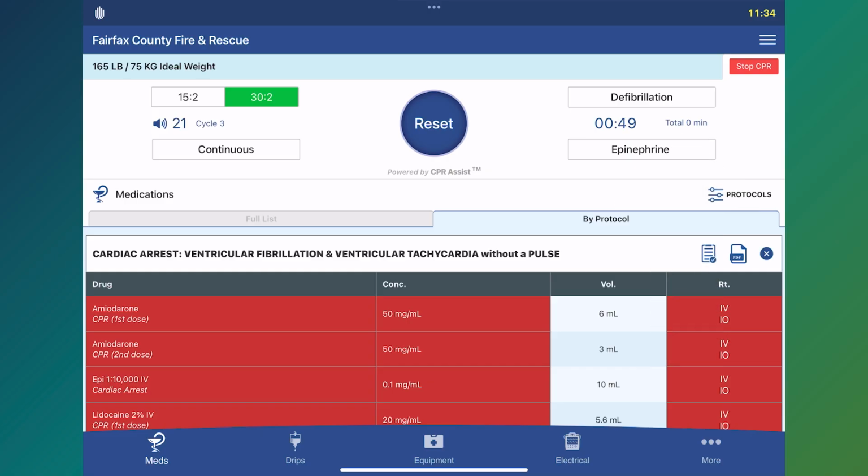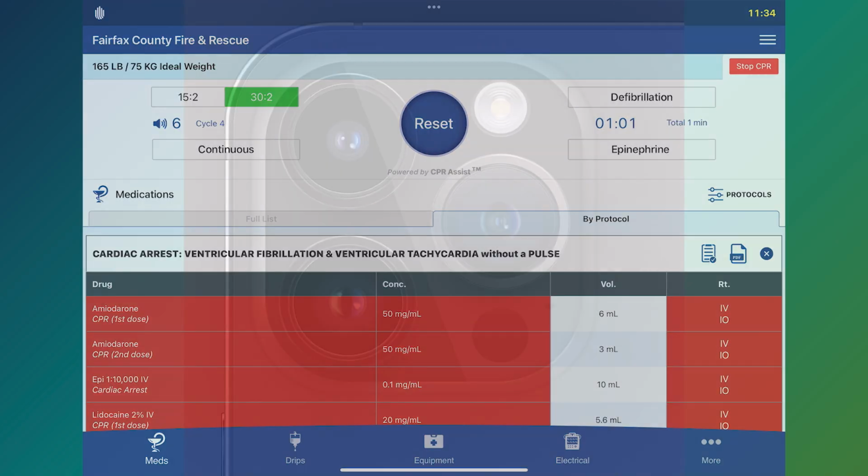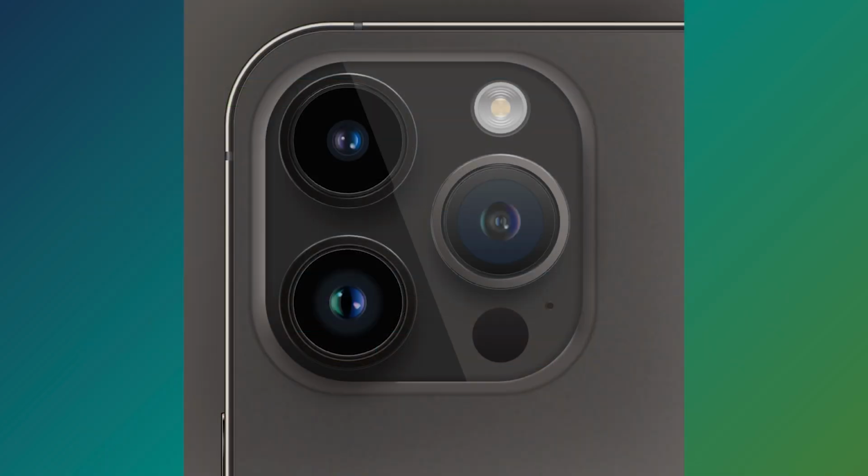After 30 compressions, Handtevy will give an audio prompt to perform 2 ventilations, as heard here. Ventilate. Ventilate. Additionally, if you are using Handtevy on your phone, the flashlight will illuminate twice each time a ventilation is required.